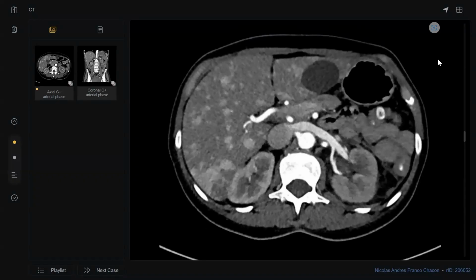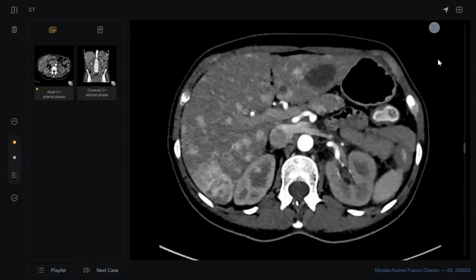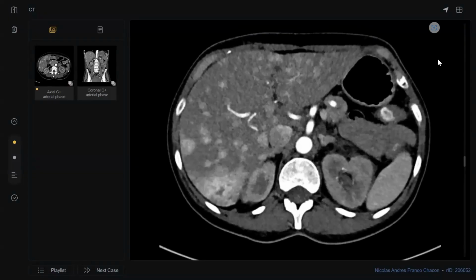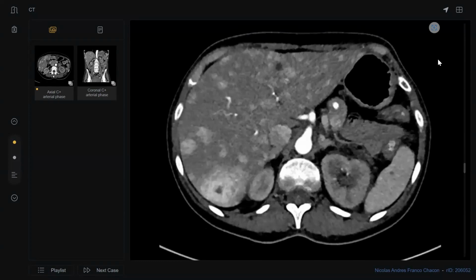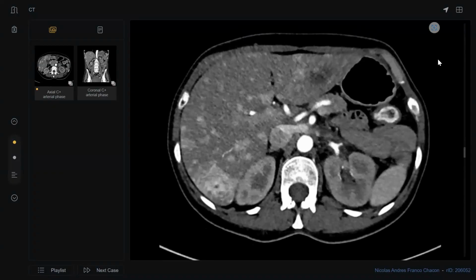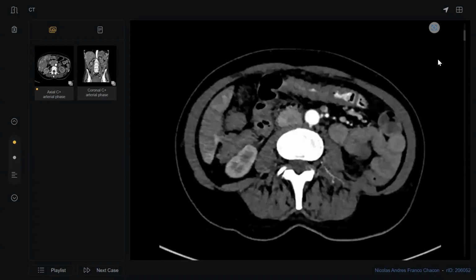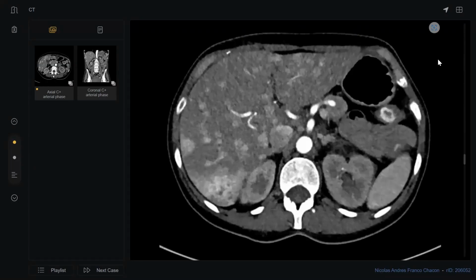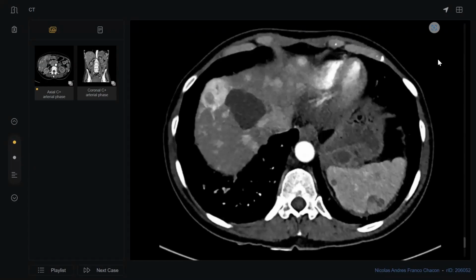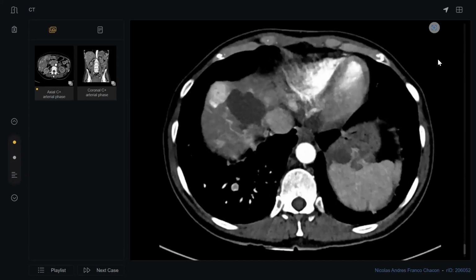In the renal pelvis, I can appreciate a heterogeneous enhancing lesion. So I'm suspecting there is a lesion in the renal pelvis. Listen to me. You take too much time describing these lesions without telling me what the process is. What are you dealing with? What is the case scenario of this?